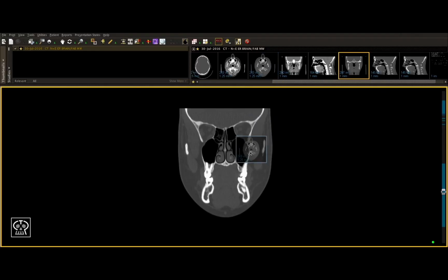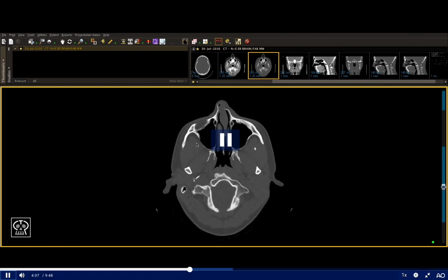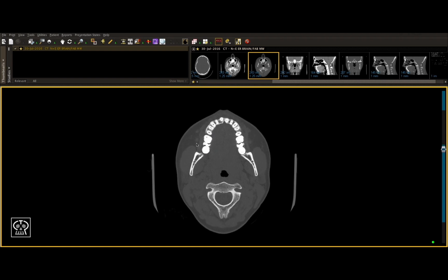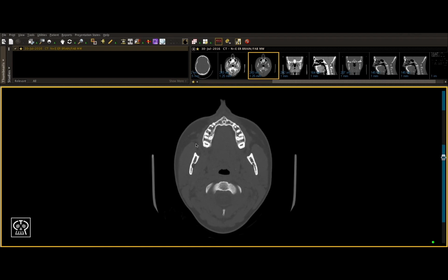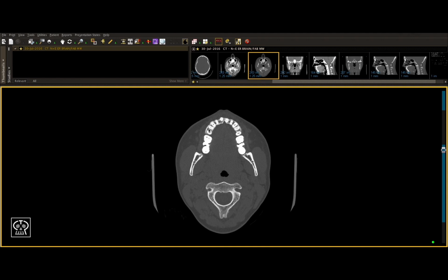Now that we've gone over the suture lines, let's talk about our approach to the ZMC region. Once again, we start off at our maxilla and we begin to scroll up superiorly. It's always important to take it one side at a time and in a stepwise fashion. For now, the first thing I'll look at is the maxillary sinuses. Remember that the zygoma articulates with the maxilla on a pretty broad plane, meaning it has attachments to both the anterior and lateral walls of the maxillary sinus.